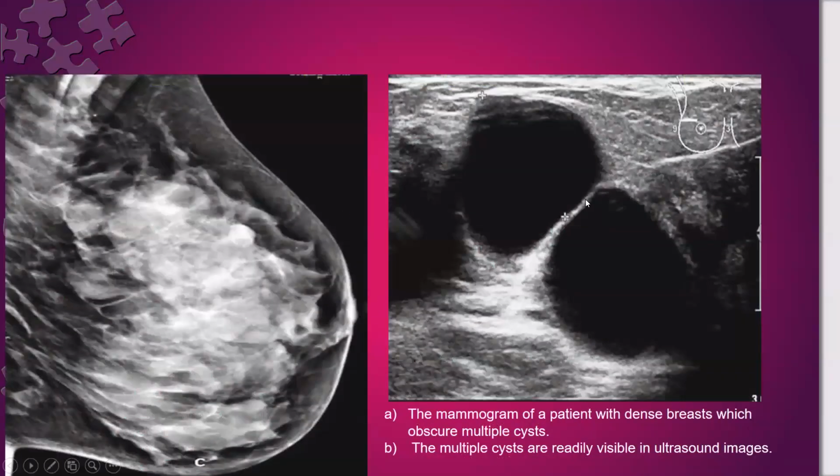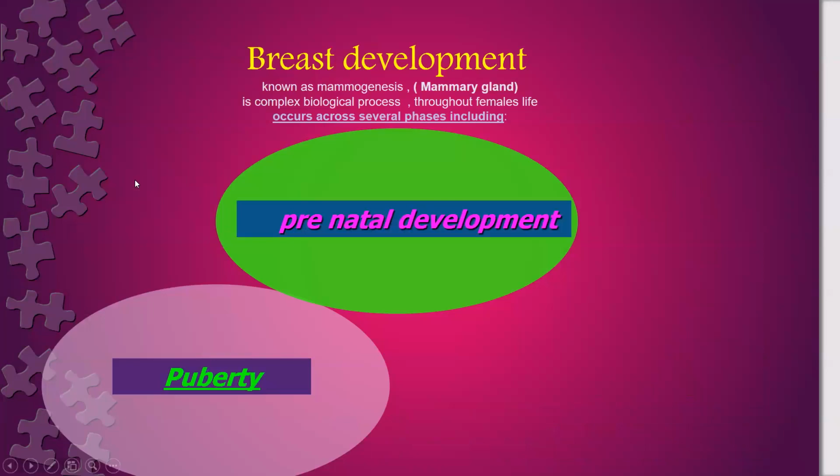Here you can see this is a fibrocystic breast. Look at the mammography, how it is nodular and how it is dense. Can you see these cysts? If I ask you to show me these cysts in this dense mammography, it is definitely difficult. What is this hint this lady is having? Calcification? No. This is the axillary tail, the axillary tail of Spence.